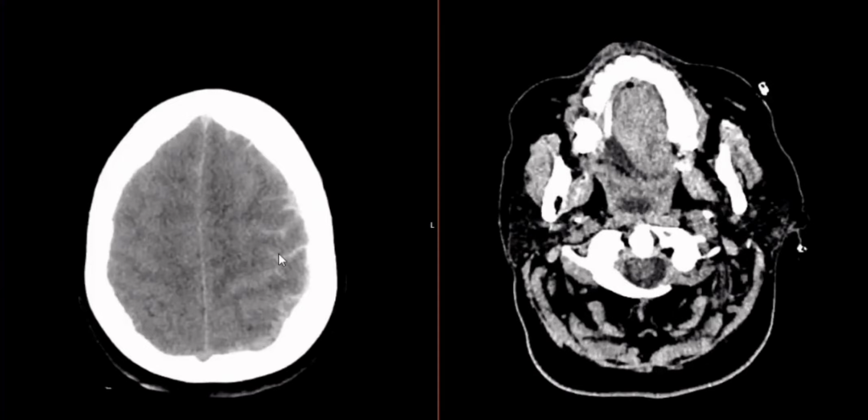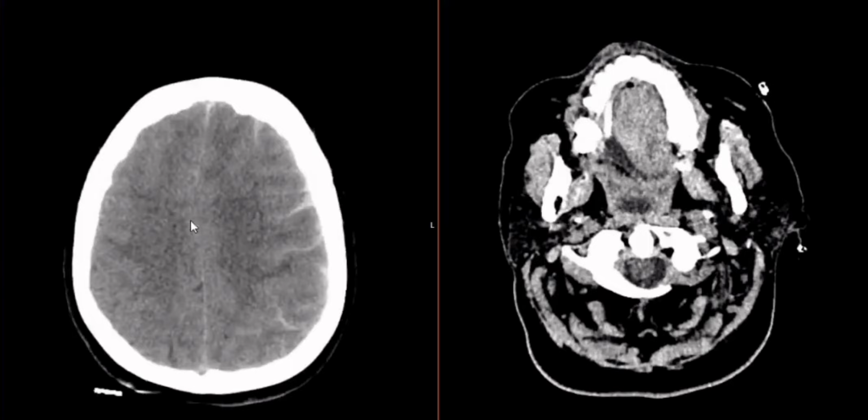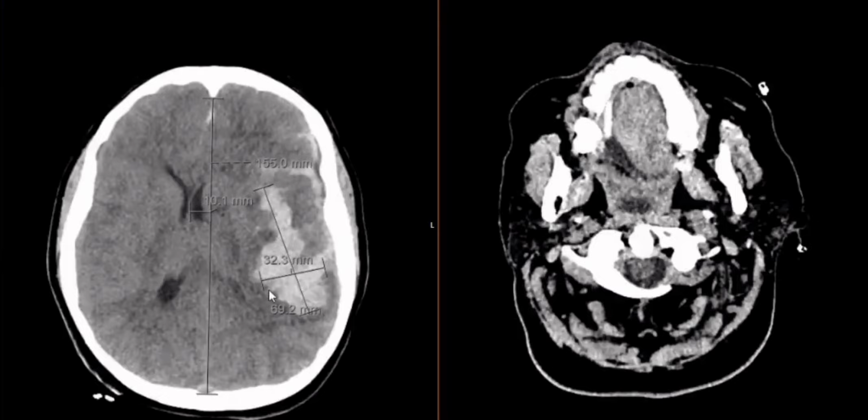So as we get further down, you can actually start to see the curve of the midline and blood into there. So the subarachnoid blood is blood that's crossed the arachnoid space, usually arterial hemorrhaging, and at arterial pressure, which creates the pressure issue. As we get further down, you'll start to see white stuff inside the brain. So this is a special kind of subarachnoid blood, which is intraparenchymal blood. And then the volume of blood and the edema around it is space occupying, which starts pushing the brain across the other way, creating a significant midline shift.